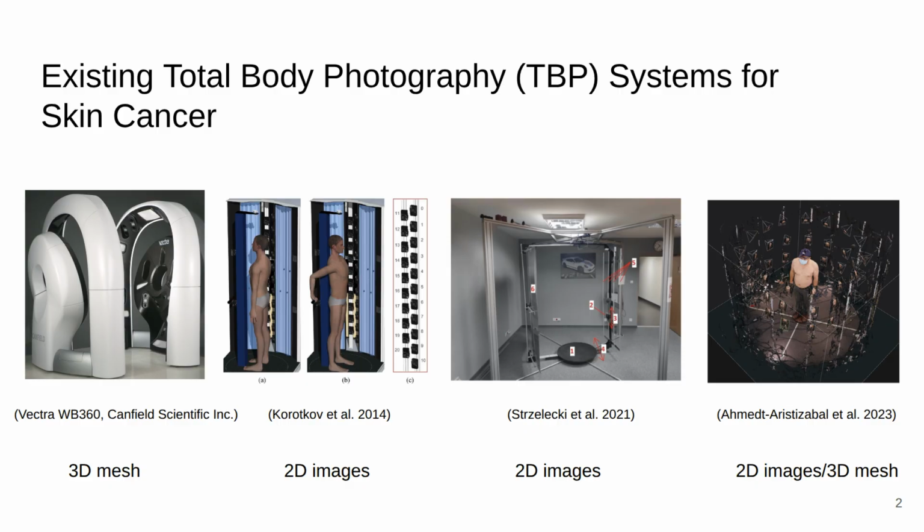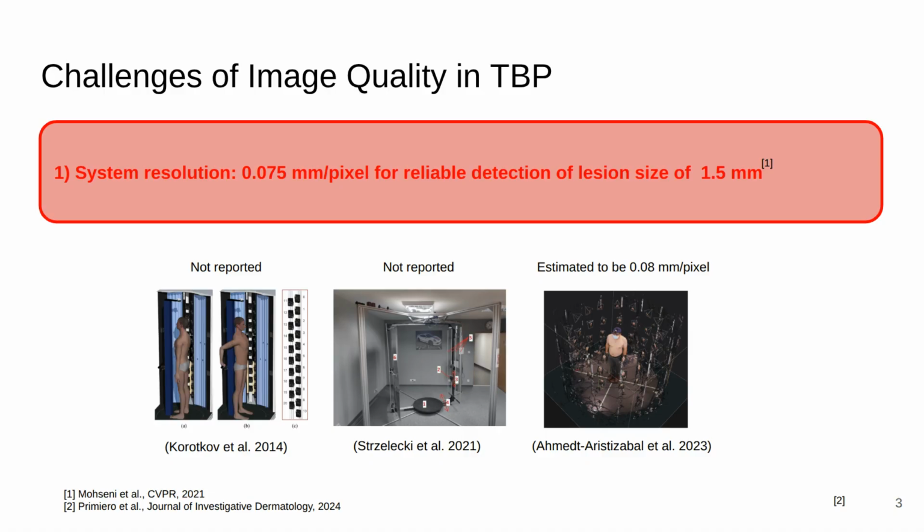Total body photography is becoming a useful screening tool for patients at high risk for skin cancer. Several TBP systems have been proposed. However, there are still challenges of image quality in total body photography. First, the system resolution is insufficient.